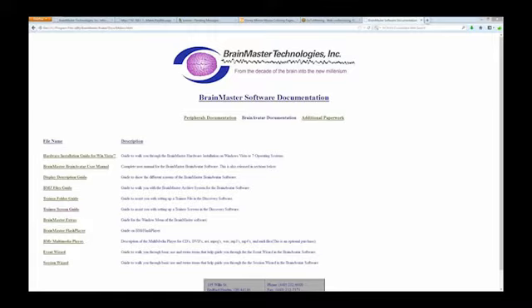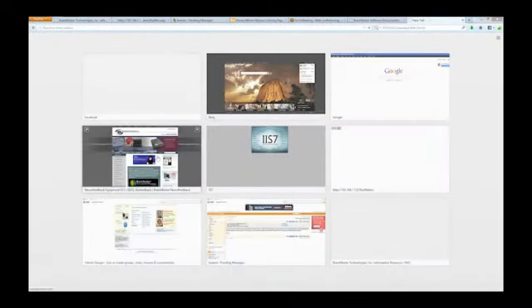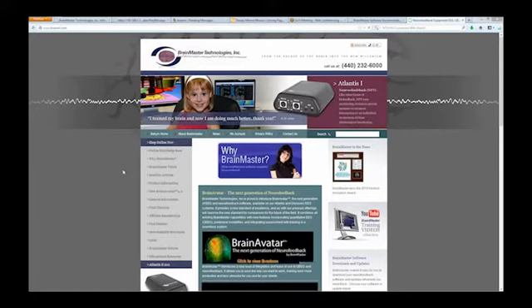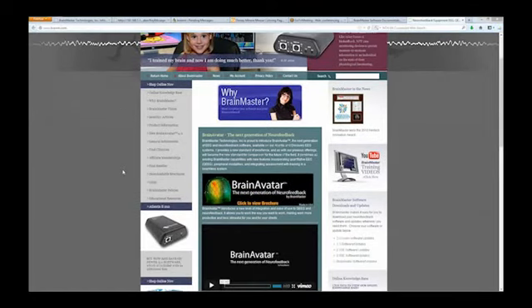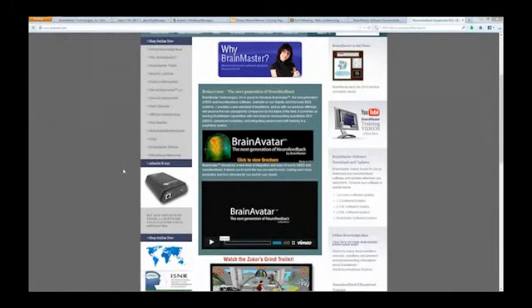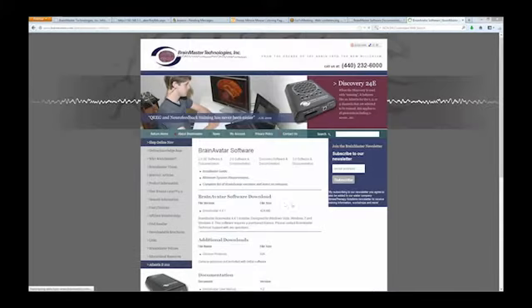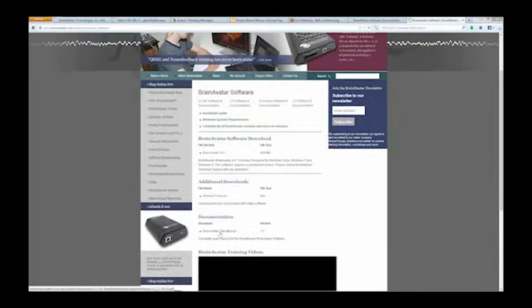Now, as most of you know, I have not gotten a chance to update the BrainAvatar user manual before this latest release of software got out. Because of that, you can download it at a different location, right here on our main brainm.com home site. If you go to BrainMaster's software downloads and updates, and then to BrainAvatar software downloads and updates, the latest version of our user manual is located right here. So you can download that and read it.